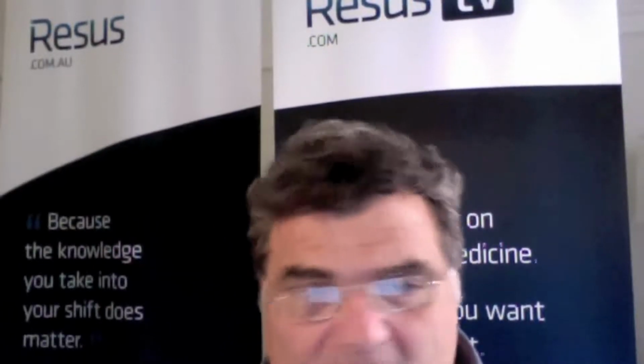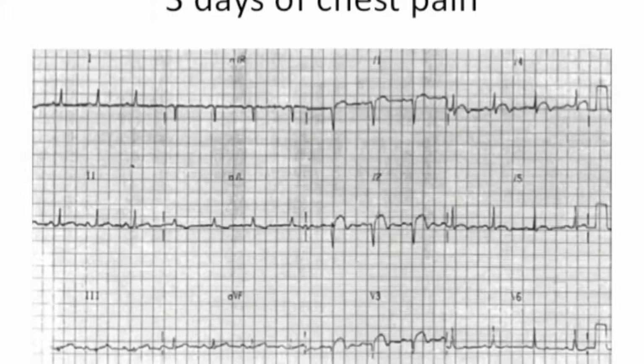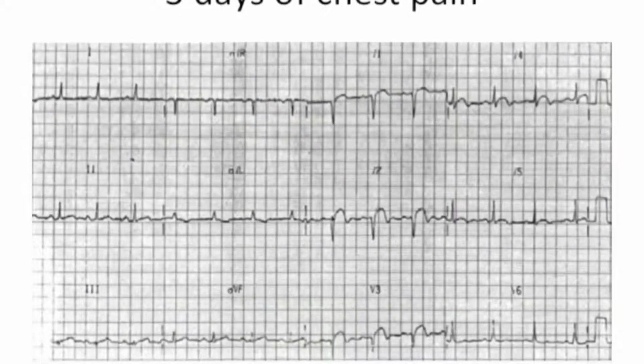So this is a man with 3 days of chest pain that's presented with this ECG. And so one of our differentials here is ST elevation MI. In fact, this patient had a left ventricular aneurysm. So let's go through and have a look at early repolarization.